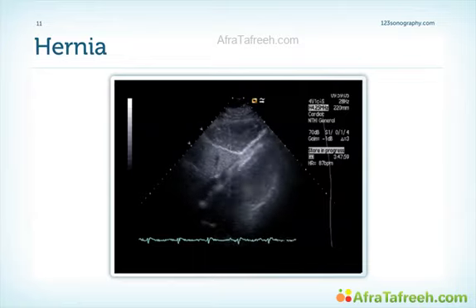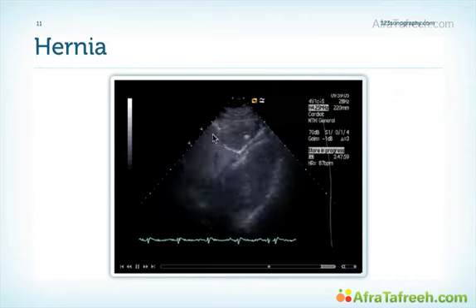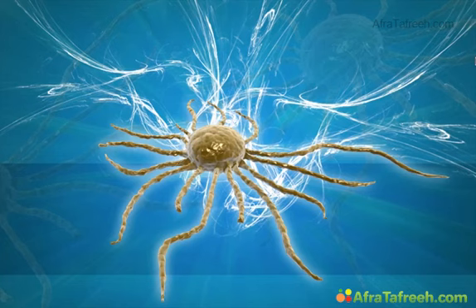Here is an example of an abdominal hernia and how we can distinguish it from a pericardial cyst. All you have to do is let the patient drink some fluid which contains gas, for example, Coke or soda. What we will see is bubbles within the structure, which represents the gas within the fluid that fills the abdominal hernia. From a fairly benign disease, we will now turn to malignancy.